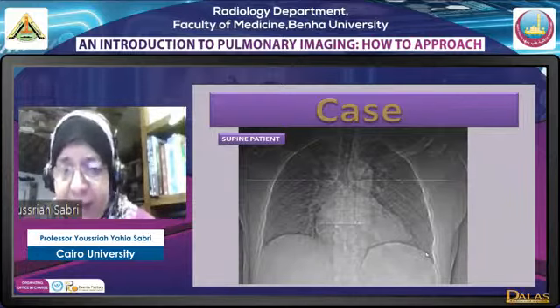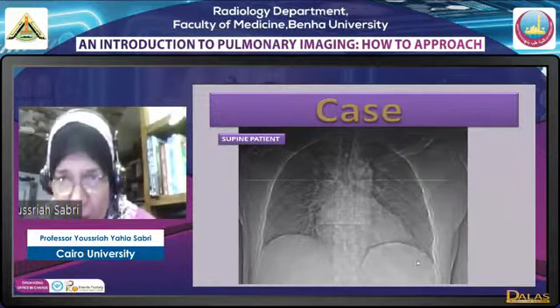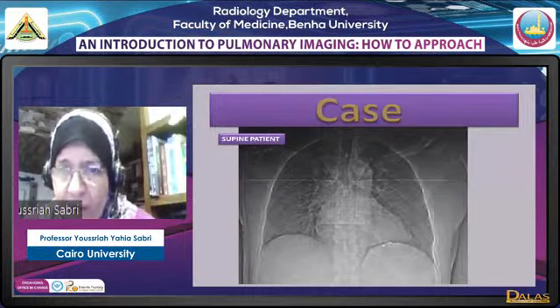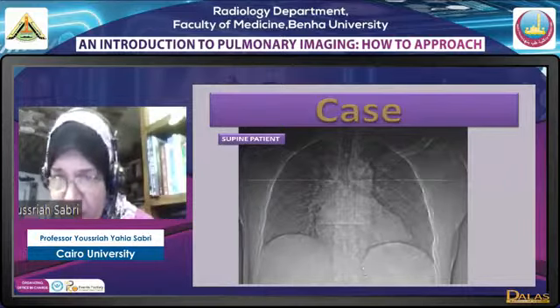And this is the clear diaphragm sign. But mark it, take care here, because you will have the same impression on the other side. You may have an impression that you have a clear diaphragm sign, so don't depend much on this sign. The most important sign to diagnose pneumothorax in a supine patient is the deep sulcus sign.